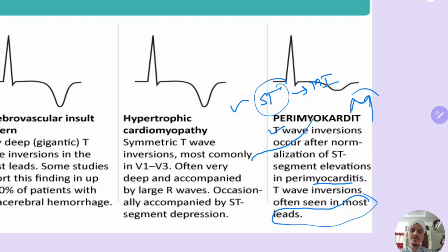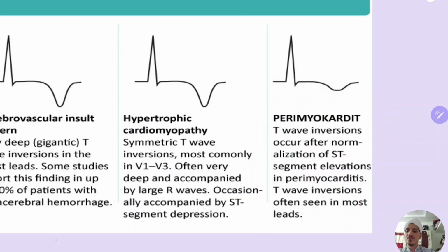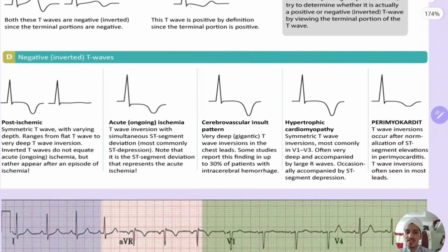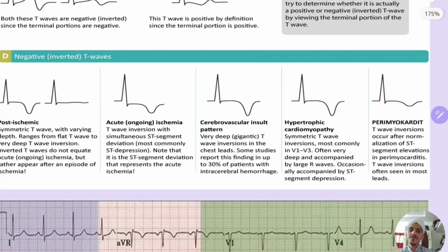So you will have this, but when the pericarditis resolves, you will have T wave inversion. Remember this point: whenever the pericarditis resolves, you will have post-pericarditis T wave inversions also. So 5 things we have learned in this negative inverted T wave topic. Let me summarize.